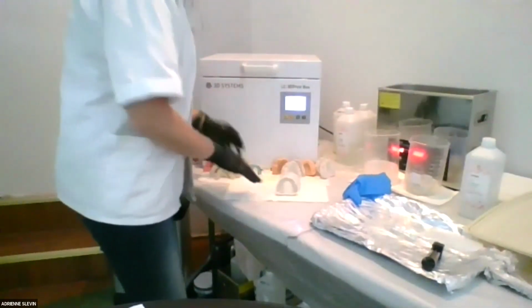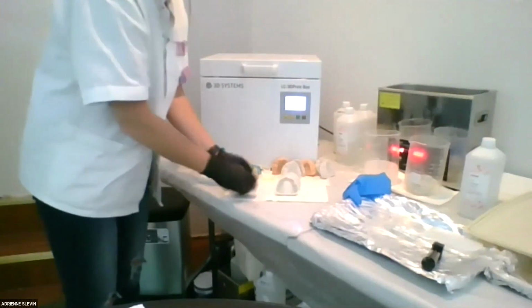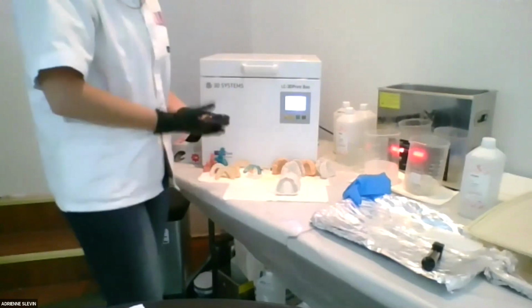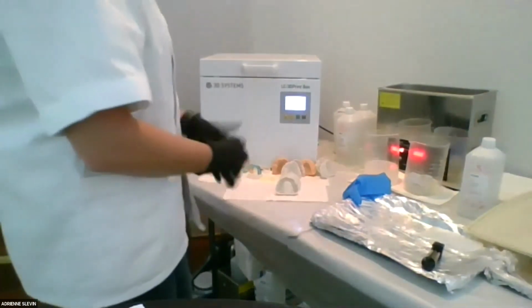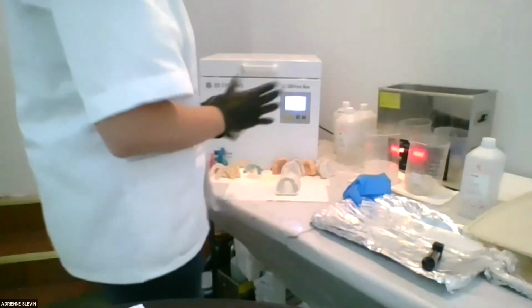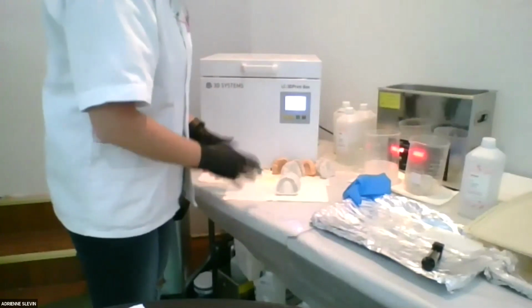Now, if you're doing your surgical guide, all of these parts here are from this case. And you don't necessarily have to have all of these models. If you're confident with your CTs and your virtual articulator and your face scan, I know people that are doing this without models. So you don't necessarily have to have all of these models. These are just different scenarios.